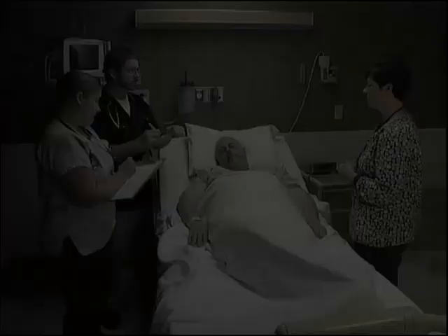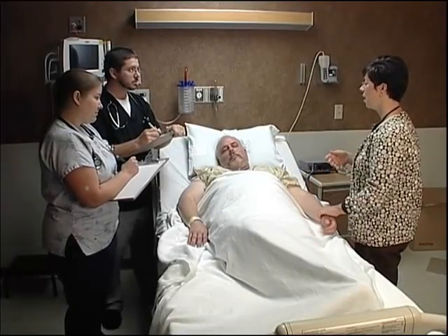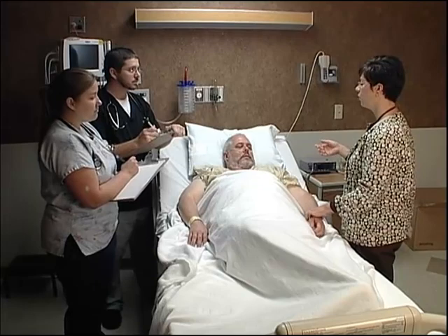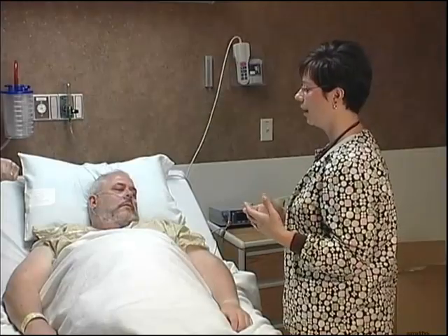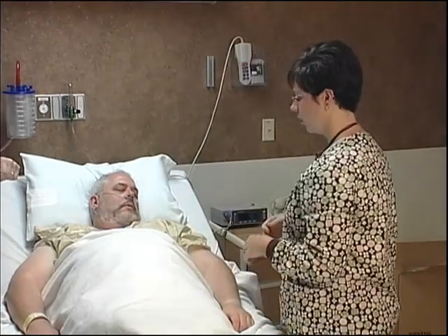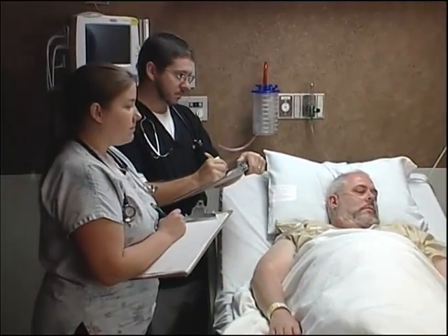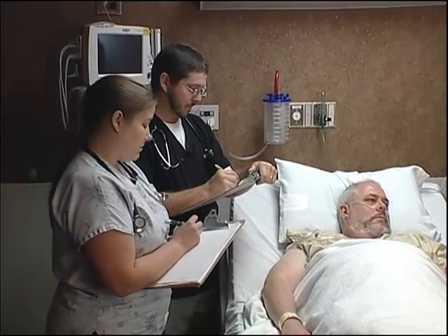Performing arterial and capillary punctures requires comprehensive training, which should include detailed instruction on respiratory physiology, anatomy, site selection and preparation, pre-analytical errors, and the risks associated with such collections. Collectors should follow standard precautions throughout the sampling and handling of blood gas specimens as prescribed by their institution's policy.